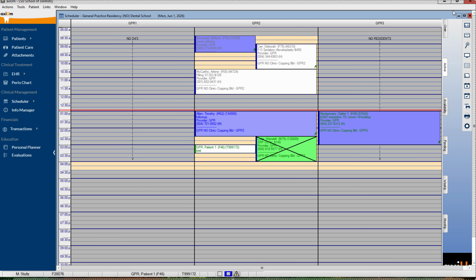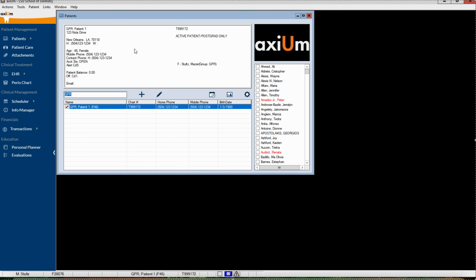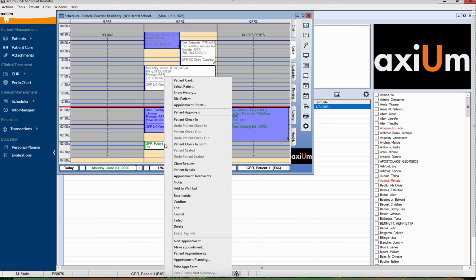So let's go back to the home screen. Okay, we're starting from blank, so let's just say we have nothing selected. Okay, we'll go to our scheduler for today. Let's say we have this patient scheduled for a comprehensive exam.